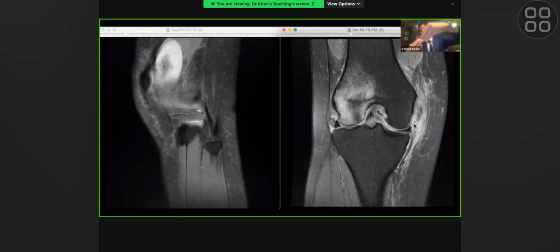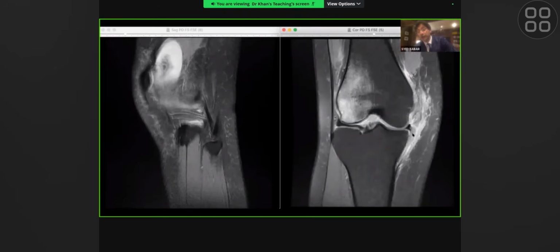Because remember, when the two bones are like this, if the force comes from outside, it'll open up the other side of the joint. When this side of the joint opens up, you damage your MCL. So that's the classic lateral to medial force vector acting on the knee joint. That's why you've got this pattern. This is a classical pattern. Force is coming from here, lots of bone marrow edema here, less bone marrow edema here, but at the same time damaging the MCL. Because this joint has actually opened up and closed again, that's why you don't see the opening up, but you've definitely now noticed the sequelae of the injury, which is the complete disruption of the MCL.